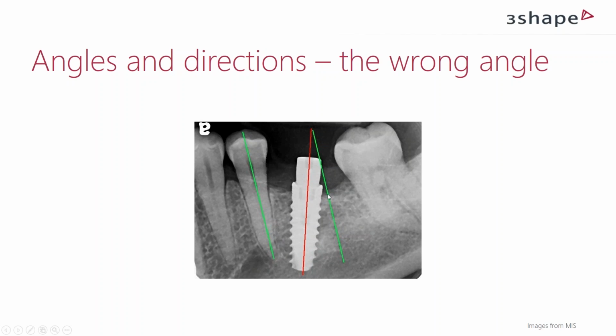Using existing anatomy that's present in our beautiful 3D CT scans coming in, that's definitely an area where you could mark up things during your diagnosis. And if we could then even adjust that with some smart helping features to make the planning safer and even easier, then I think that's something we will be looking into.